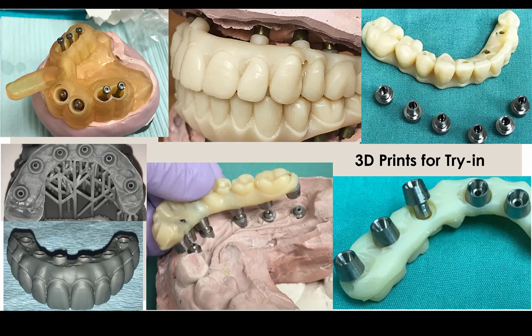It can be a simple solid resin print that screws directly down to the implant platforms, or for greater stability and radiographic confirmation, you can place pre-made supportive titanium posts that can be luted to a print. These posts can also serve as a foundation for a provisional you could potentially generate for minimal to no cost after keying the prototype on the model and using your acrylic of choice.